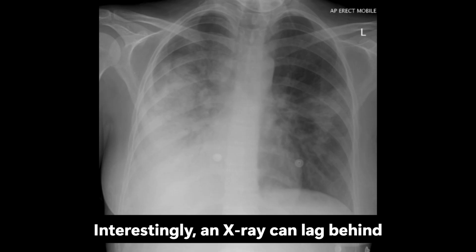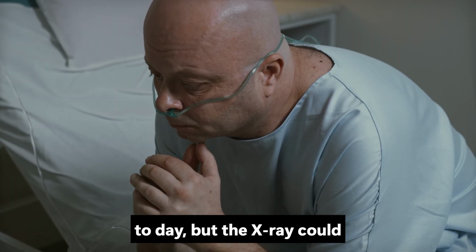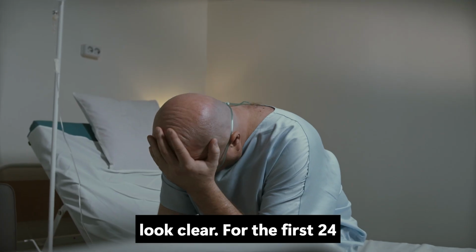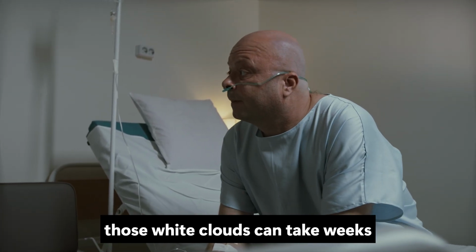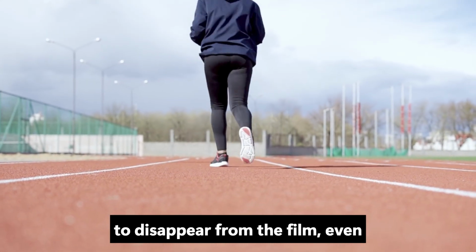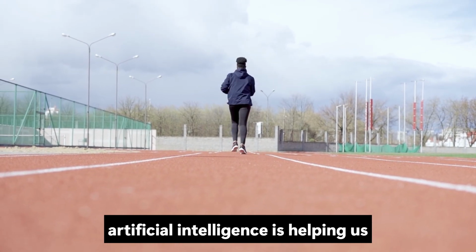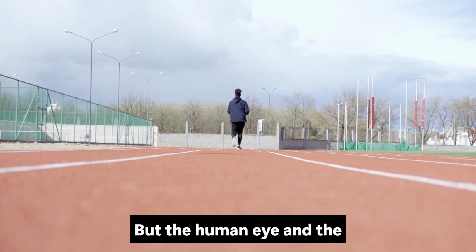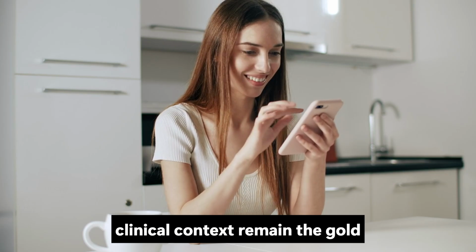Interestingly, an X-ray can lag behind reality. A person might feel terrible today, but the X-ray could look clear for the first 24 hours. Conversely, as you get better, those white clouds can take weeks to disappear from the film, even if you feel 100% recovered. Today, artificial intelligence is helping us catch these signs faster than ever, but the human eye and the clinical context remain the gold standard.